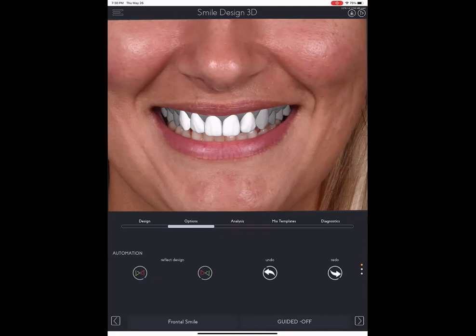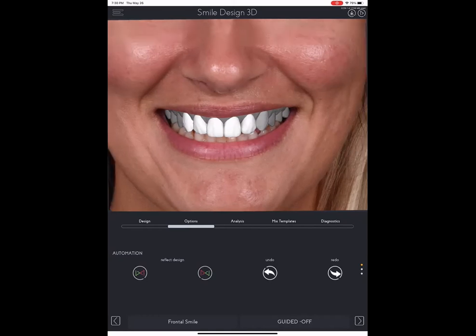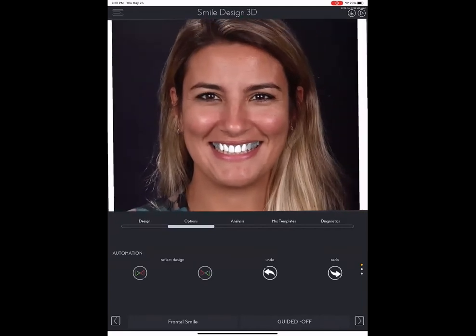Okay, so again, SmileFy was created for dentists, so you guys can create multiple versions, create multiple treatment plans. And we understand, because I am also a dentist, Samia is also a dentist. We work in a very hard and very fast environment, so we cannot spend too much time doing dental wax-ups, working with the digital workflows. This is the reason why everything is automated. But we cannot visualize the dental wax-up only from a frontal view.